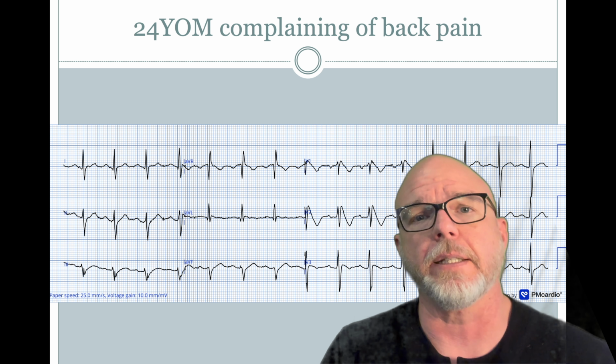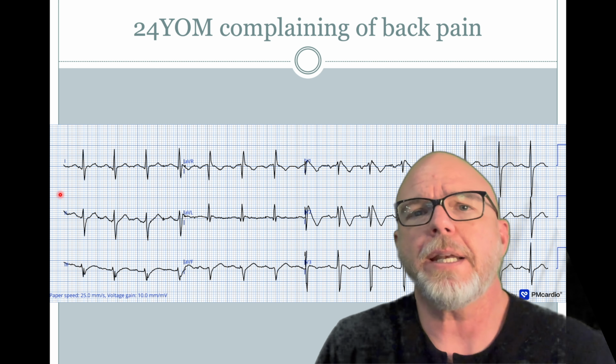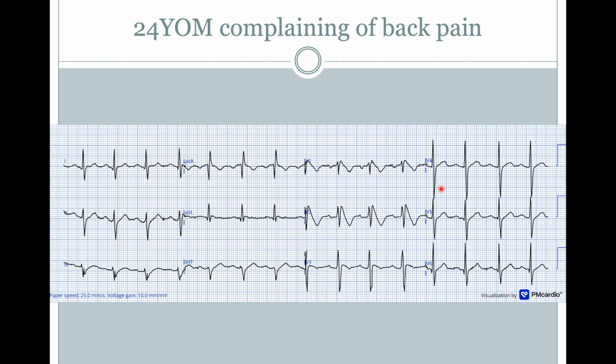They found this finding. Now, if you just look at this, this kind of relates to what I'm talking about, where you might not know the name of it, and that's okay. Would you identify this rhythm, this 12 lead, as being a little bit unusual? And I would hope so, yes. Look specifically at V1, V2, and V3. That's where our problem lies. I'm going to zoom in a little bit.